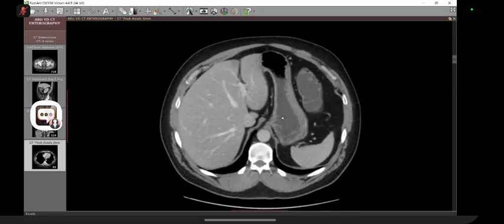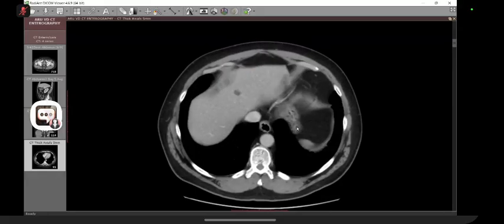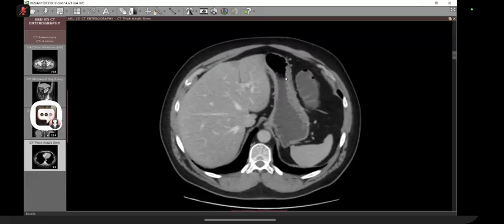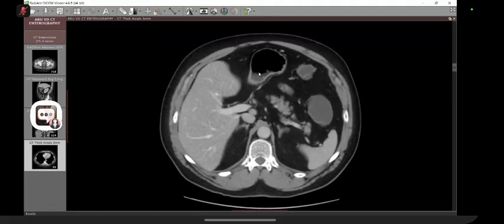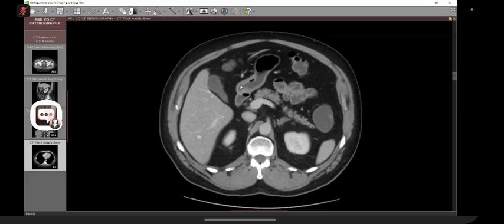Now, please remember that the first part, the superior most part, the fundus, is sitting here, which is just below the diaphragm. And then as we go anteriorly, the antrum comes. Point to remember on a CT anatomy: the gastric antrum is the part which goes from left side to the right over the spine. So you will see that it will start going to the right. It is going to the right. And this is the pyloric canal. And then we come into the duodenum.